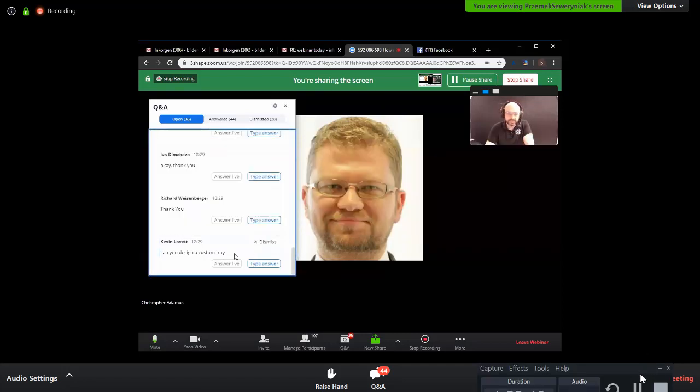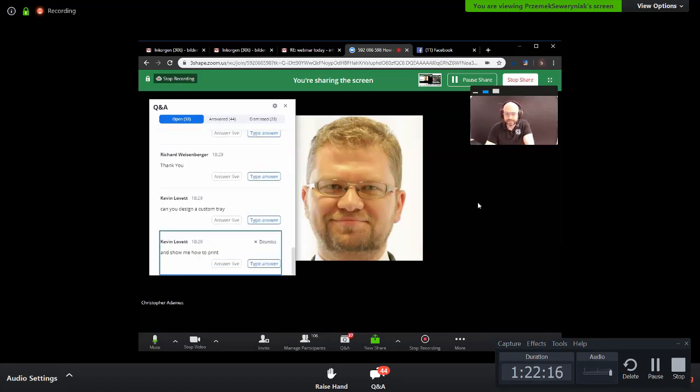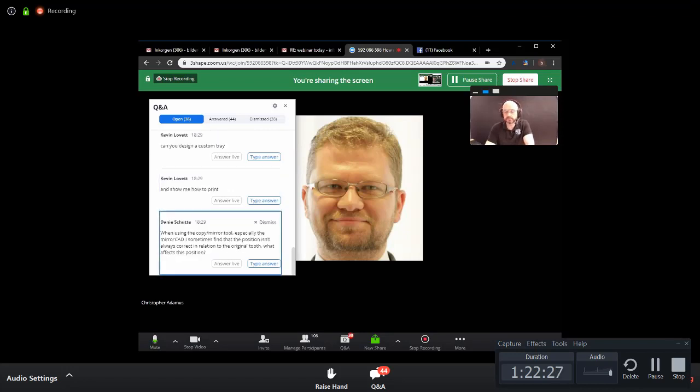Can you design a custom tray? Yes, I can. It's really fast. I will not do it this time, but you can. You probably can go into the YouTube channel for 3Shape, where you have a lot of this easy stuff, and look at it.